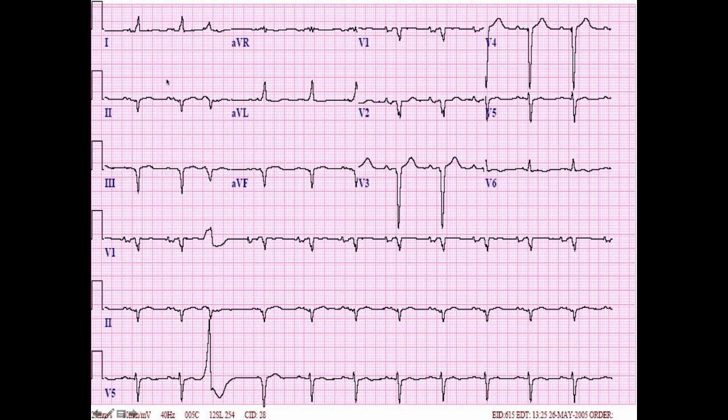Lead 1, lead 2, and I see a little notch right there in the P wave. Same thing in lead 2, little notch. Little M going on, little P mitral. Let's go to V1, look at V1. We do have a biphasic P wave, and that second portion is a lot bigger, a lot wider than that first positive portion. So we can confirm our left atrial enlargement.